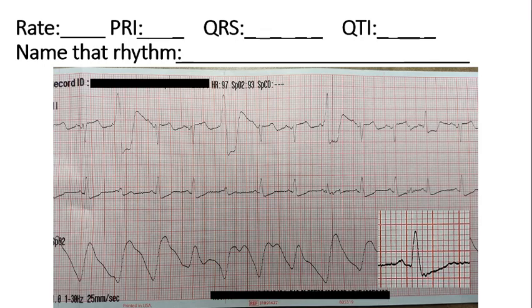Here's another one. Here's some irregular beats in here. If you start off by looking at the P wave, probably look in lead 1, which is the center EKG strip here. You'll see you do have P waves. They are pretty consistent for the most part, except these little extra beats that are placed in among them. So this is an underlying sinus rhythm, and the box at the lower right is representative of the baseline rhythm. You can count that if you want to.